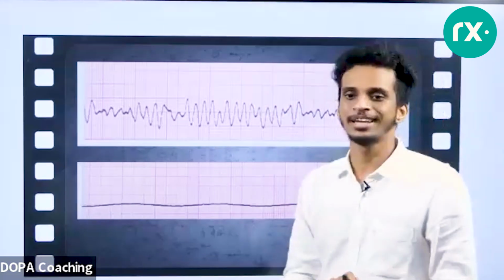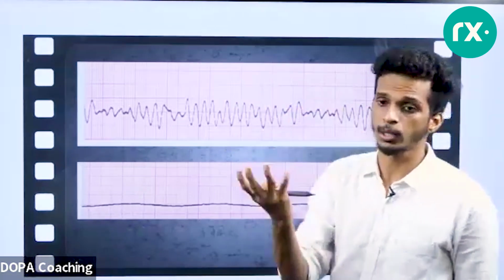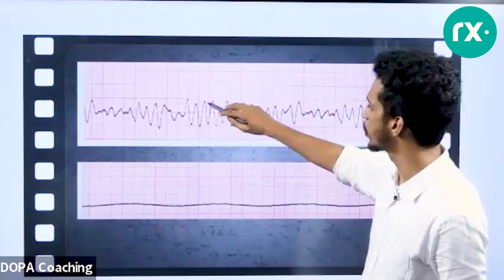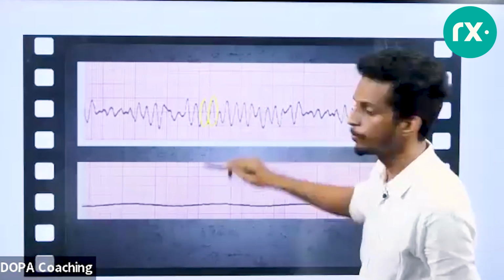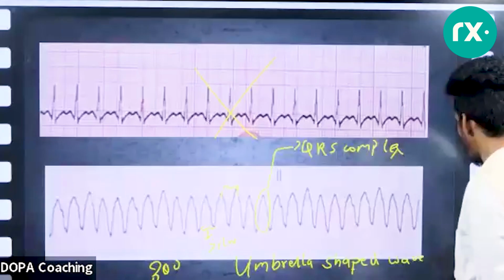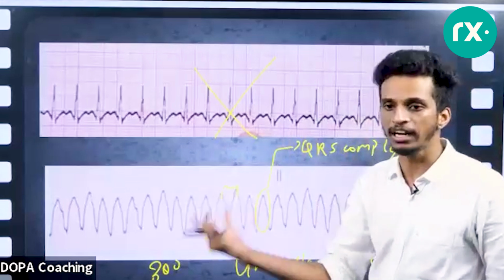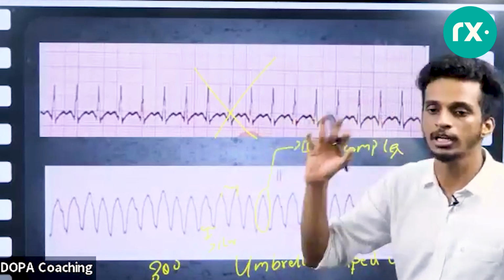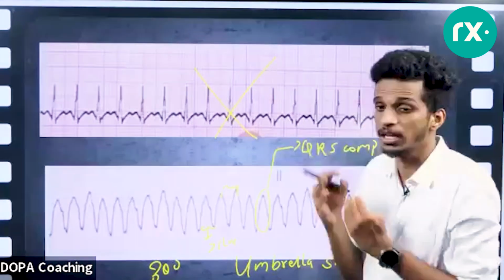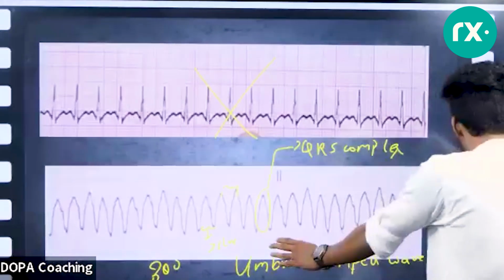So this is the next ECG. Again, now we have spoken about ventricular rhythms, and just by your glance you can understand that each of these is QRS, similar to ventricular tachycardia. What we saw here is the QRS originating from the ventricle. So whenever the arrhythmia is originating from the ventricle, we are going to get a wide QRS. So this is ventricular tachycardia.